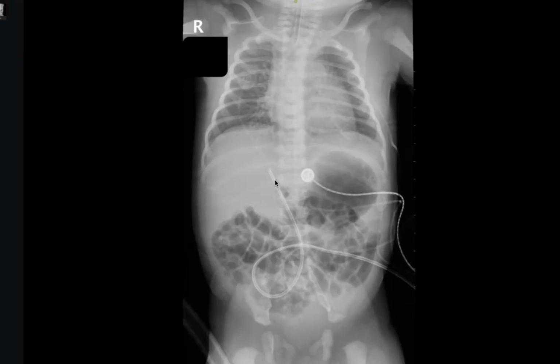Okay, we talked about the lines. What about the chest or the abdomen? Where is the abnormality? As the patient presented with respiratory distress, I would like to zoom and see the chest images. In the lungs, I can see mild airspace opacities in the perihilar region, more marked on the right side.